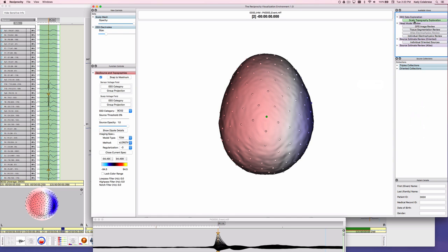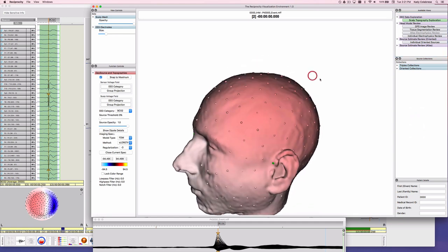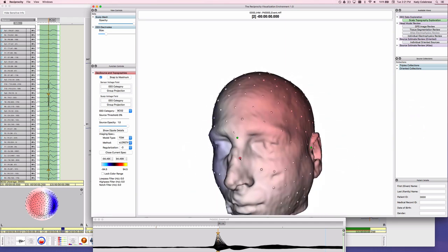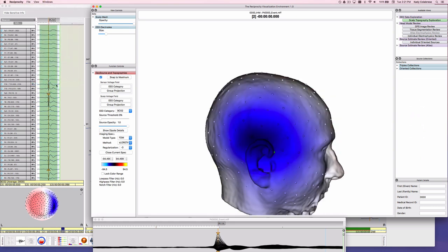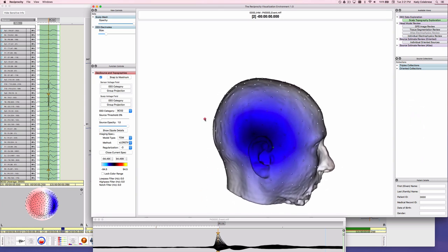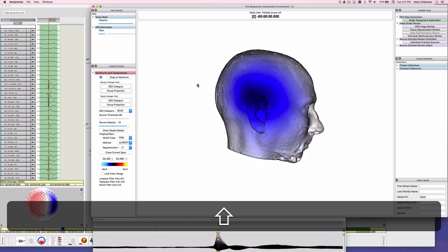Use the 3D topo map to assess your data and further your understanding of the data in the 3D space. Hold down the left-click button and drag to view different sides of the 3D topo map. Click on View in the toolbar to use default controls to change the viewing angle. You can zoom in and out by holding down the right-click button and dragging the mouse. You can move the images on the screen by holding the Shift key and then the right-click button and dragging the mouse to move the image.